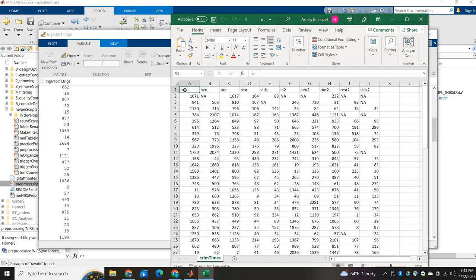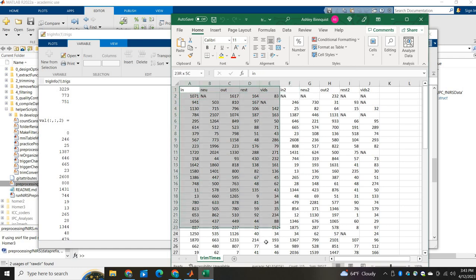And so you can tell right here, this is subject 1. It says, okay, this is the trigger I want to trim at, which is true for subject 1. Subject 2 is actually right here. So if you have a single scan, you'll only need it for each scan.